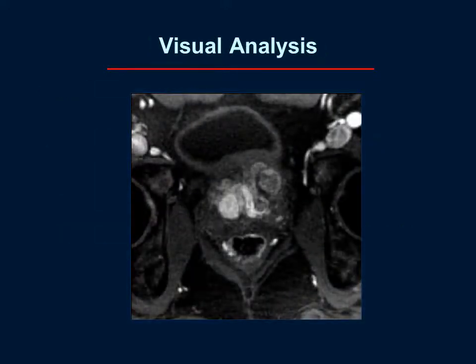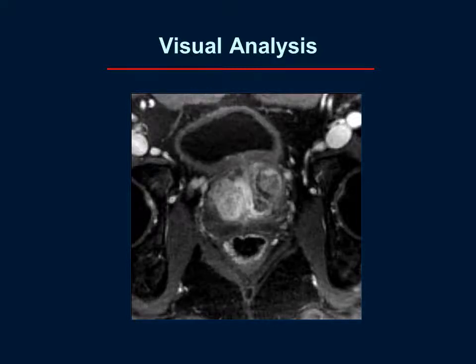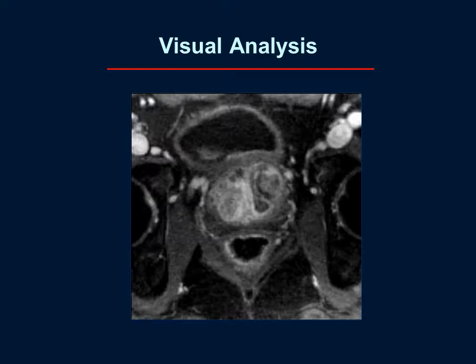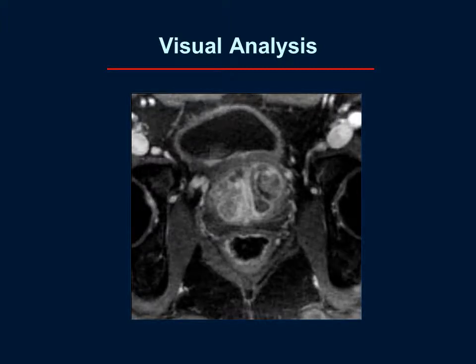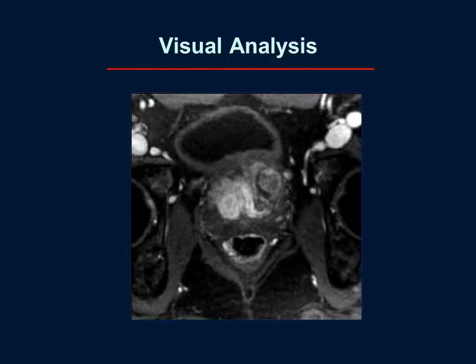So here we can see a visual analysis, this little focus of early enhancement within the left peripheral zone, and just seeing the serial time points, we can appreciate that initial rapid wash in that area. And again, here we see that little focus.